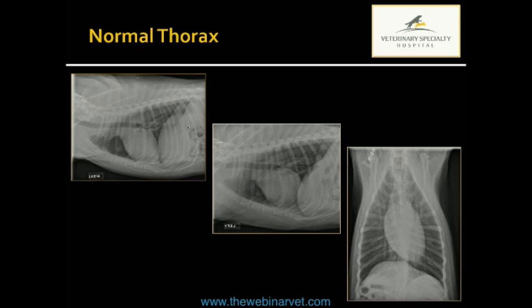And then ideally we would have skin margins all around, but that's not always feasible. In a very large dog, it might take many more views, but certainly if it's a trauma case where there could be something extrathoracic that's then involving intrathoracic structures, as much as possible you try to get as much of the chest cavity and skin and subcutaneous tissues as you can. So in this case, positioning and technique is adequate for all of the views provided. Obviously you want to make sure that they're labeled appropriately.